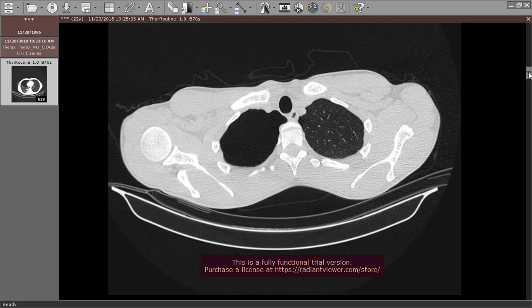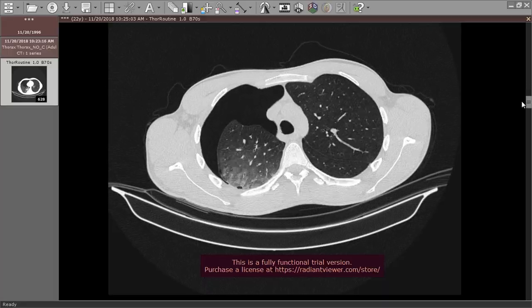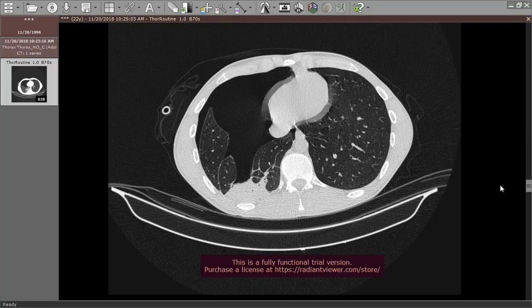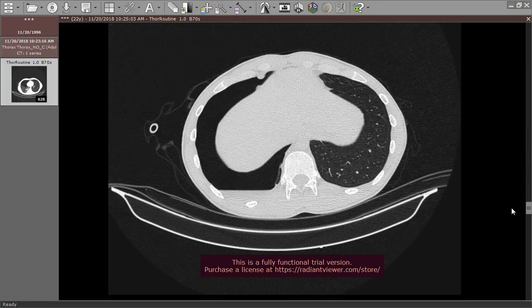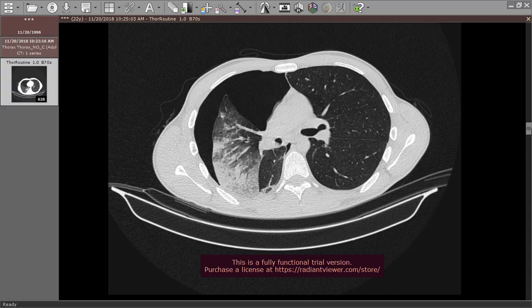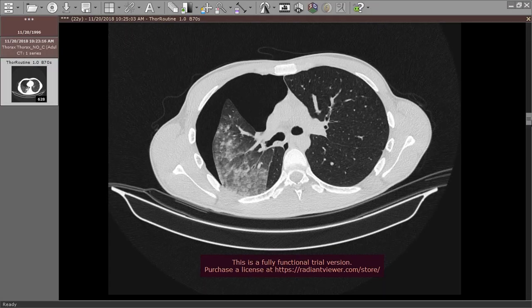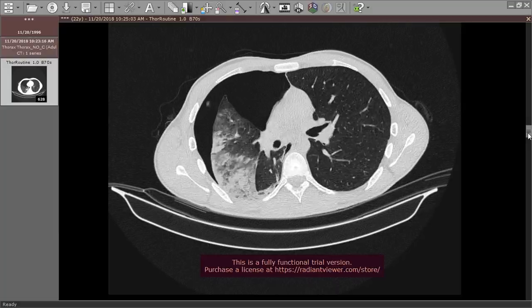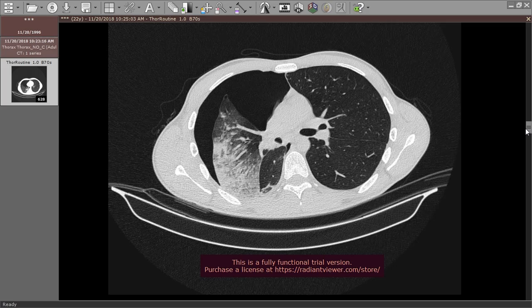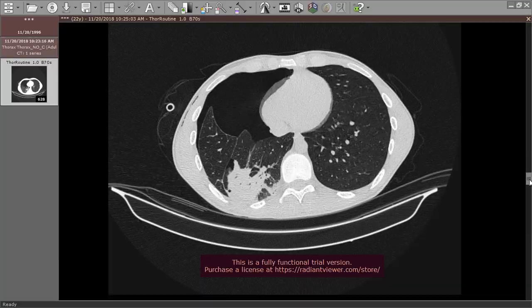Case number 4, another case of trauma. Just to show you the pneumothorax and hemothorax, and this is the intra-alveolar hemorrhage. This confluent ground glass opacity, heterogeneous ground glass opacity, more at the periphery, opposite to the pulmonary edema and the collapsed lung.